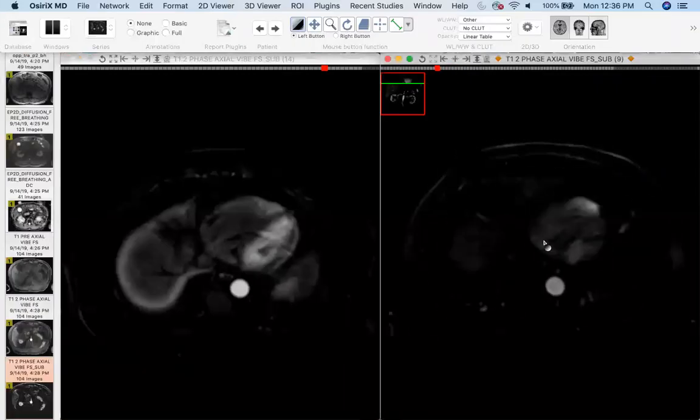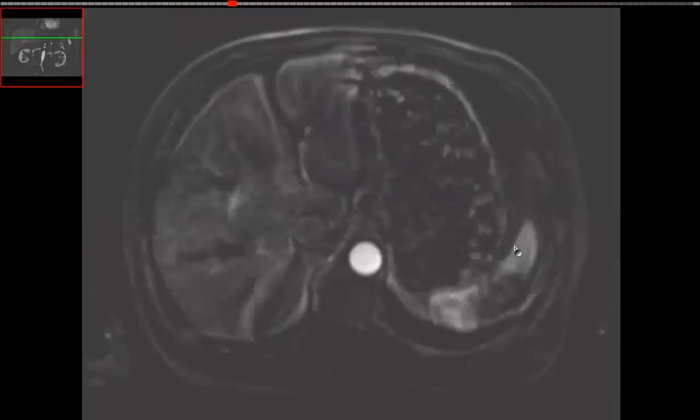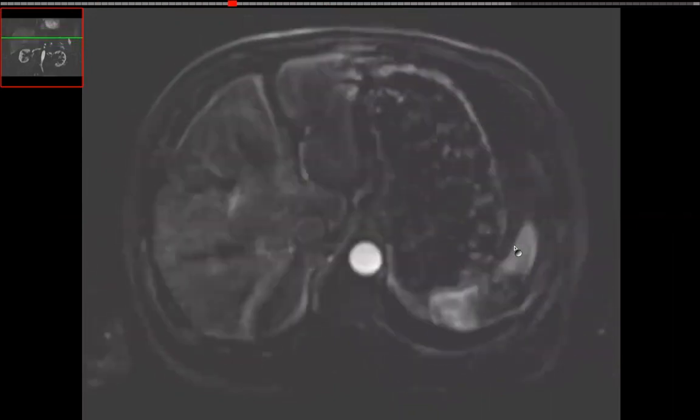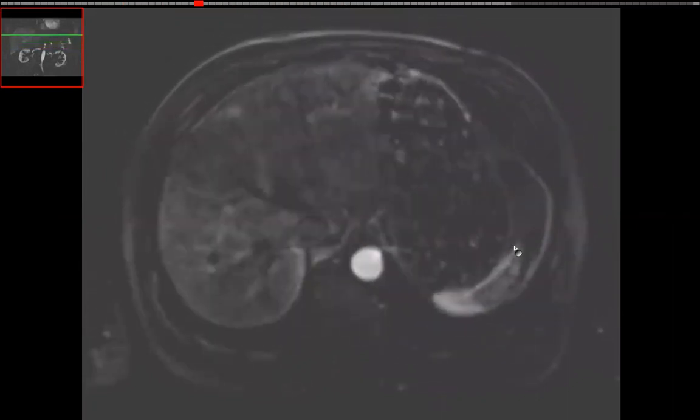But I saw this and I thought, it's just a thin wedge. And the patient got a follow-up, and it all got much better. So this is the follow-up, and you see it's less pronounced. Well, it's not that it got better, because look, the phase of imaging is slightly different. So it's just the timing. This one is a little earlier than the other one. That's the reason.